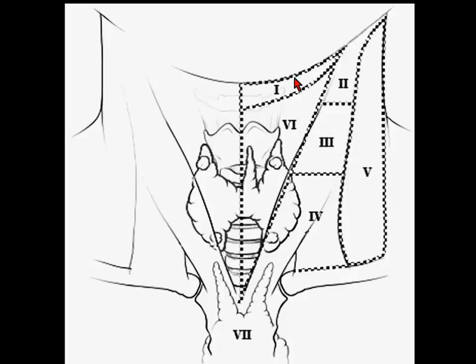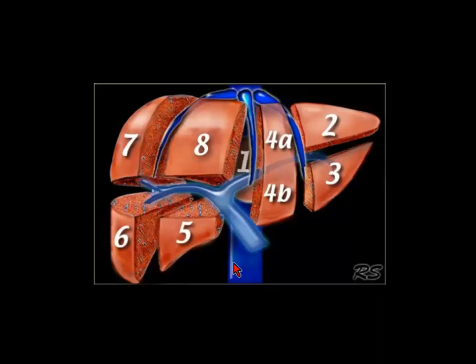So that's what is from anterior, so that's level 1. So that's level 2. So midline is level 6. And from here to here, that's the bone landmarks, very easy, so that's 3. And always anterior and posterior to the vessels is 2A, 2B. Below that is level 4, and sternum is 7. So it shouldn't be a problem now for reporting.